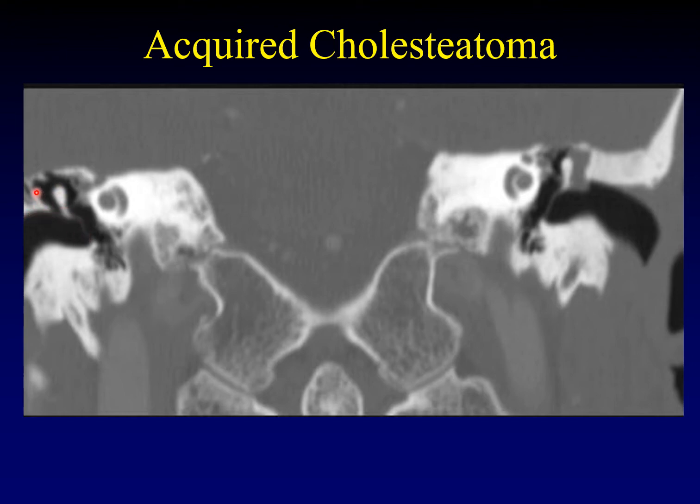This piece of bone here, forming the lateral wall of the epitympanum, that sharp pointed bone is called the scutum. It's a reference to the shield that Roman legionaries used, the scutum. Now, the scutum and the malleus are on either side of this air pocket, the lateral aspect of the epitympanum. That air pocket is Prussak's space. This little piece of the tympanic membrane is the pars flaccida right next to Prussak's space.